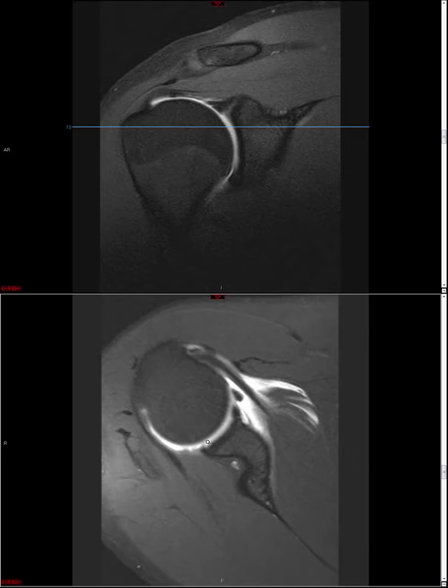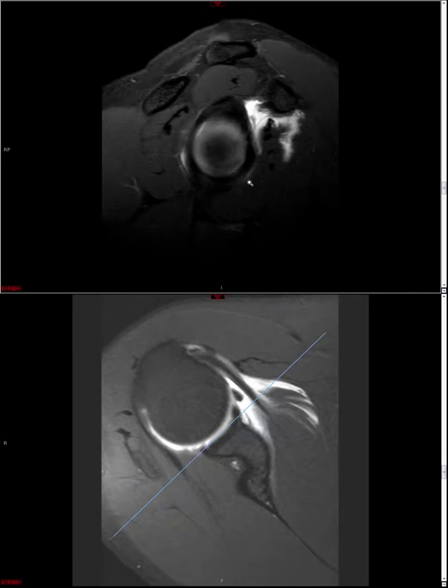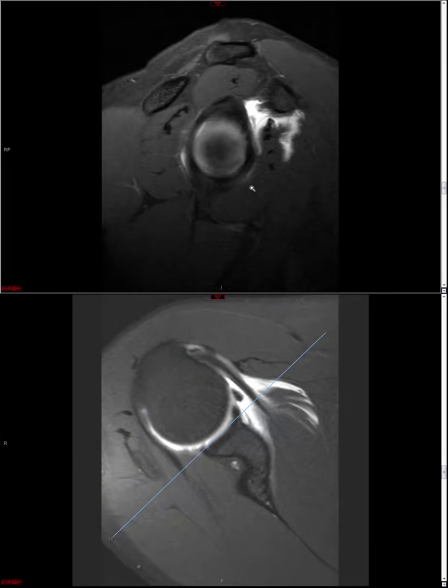And as we talked about in the knee, I think it's helpful to talk about whether or not the chondrosis you're seeing is generalized, involving the entire joint, or focal. And if it's focal and you think it's acute, or it's an actual discrete osteochondral injury, then it may be worthwhile to give measurements as to the size of the region of involvement as well. Sometimes you might see high-grade chondral defects, as in the knee. On the sagittal sequence, I wouldn't recommend using the sagittal primarily, but sometimes you'll appreciate the discrete high-grade defects quite nicely in the sagittal as well.